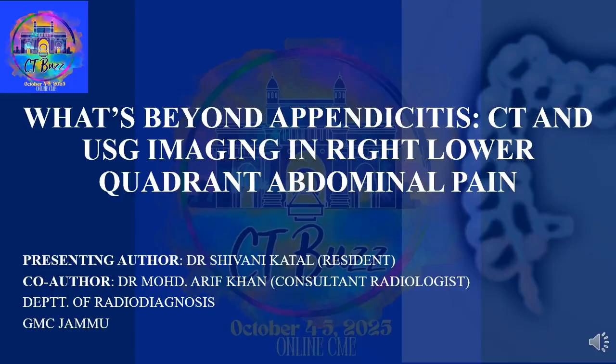Good day, everyone. I am Dr. Shivani Katal, and my topic is What's Beyond Appendicitis? CT and ultrasound imaging in right lower quadrant abdominal pain.